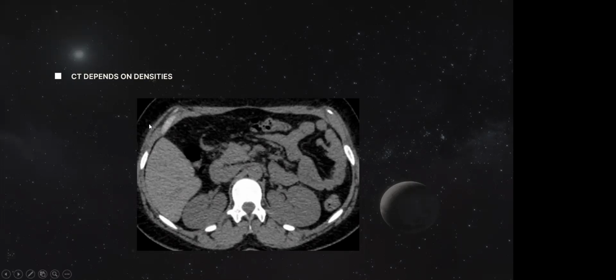This is an image of a CT abdomen. You can say this is the liver, this is the kidneys, these are the bowel loops, these are some of the vessels, some are lymph nodes. We really can't differentiate between these with much clarity, and you certainly can't identify all the diseases here, so you need the help of a contrast. The same happens with the brain.